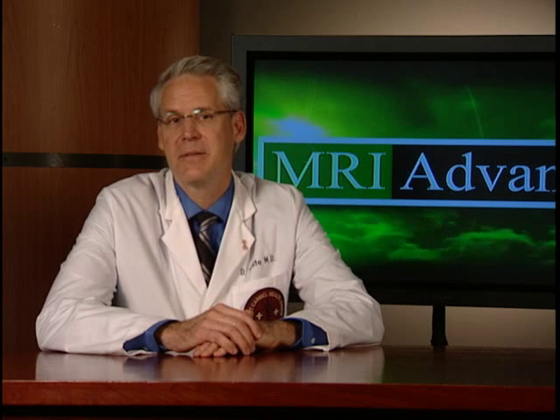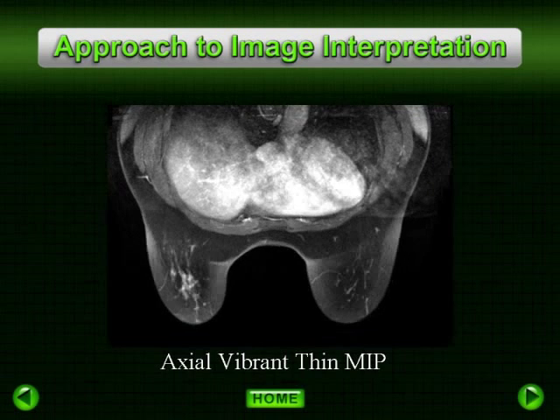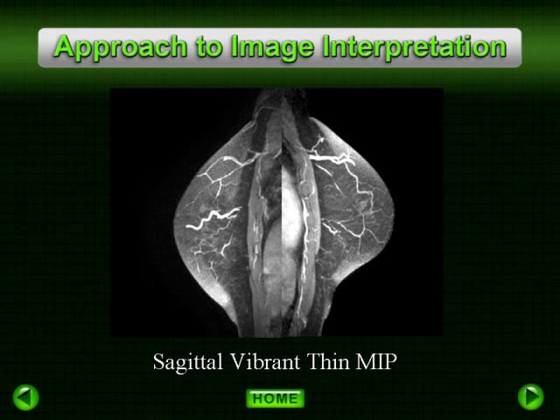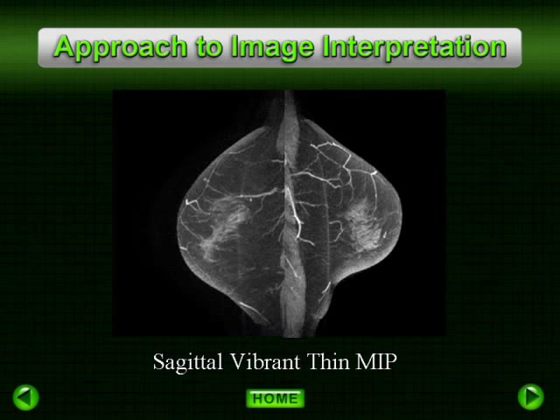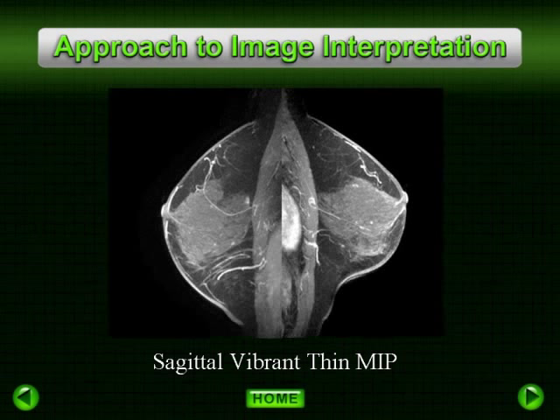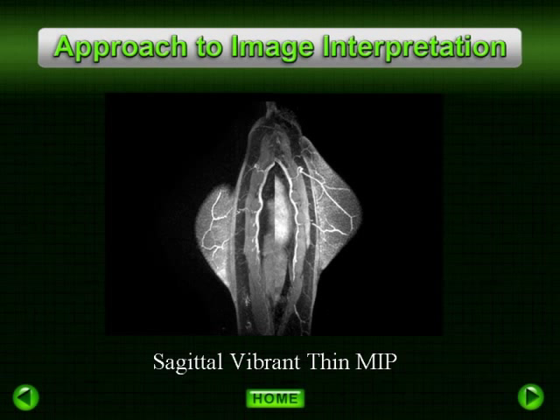We have designated a thin MIP slice thickness of 1.5 centimeters. This was somewhat arbitrary. However, after evaluating multiple slice thicknesses, we felt this gave a very nice, somewhat three-dimensional overview while allowing us to step sequentially through the breast tissue. This is an example utilizing the axial parallel imaging protocol. Here we demonstrate again the 1-minute fat-saturated thin MIP acquisitions with a sagittal parallel imaging protocol. Be sure to design your hanging protocols to again image the breast bilaterally and simultaneously as you survey the parenchyma.